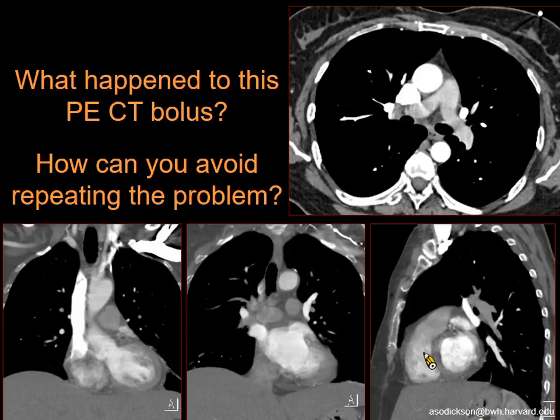Because this is one that I would love for you to understand thoroughly here. So the right answer here is transient contrast interruption, largely due to Valsalva effect. We know that we're not too early because we have contrast in the aorta. We know that we're not too late because we have contrast in the SVC. So this is very strange, right?